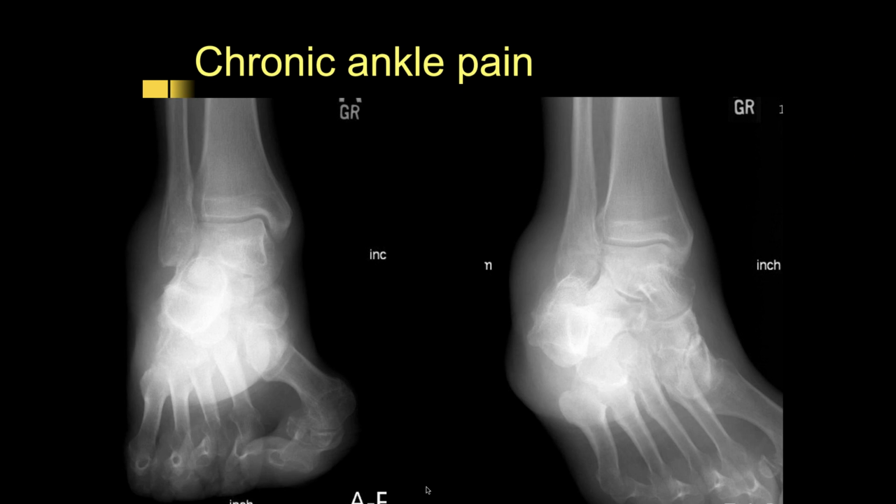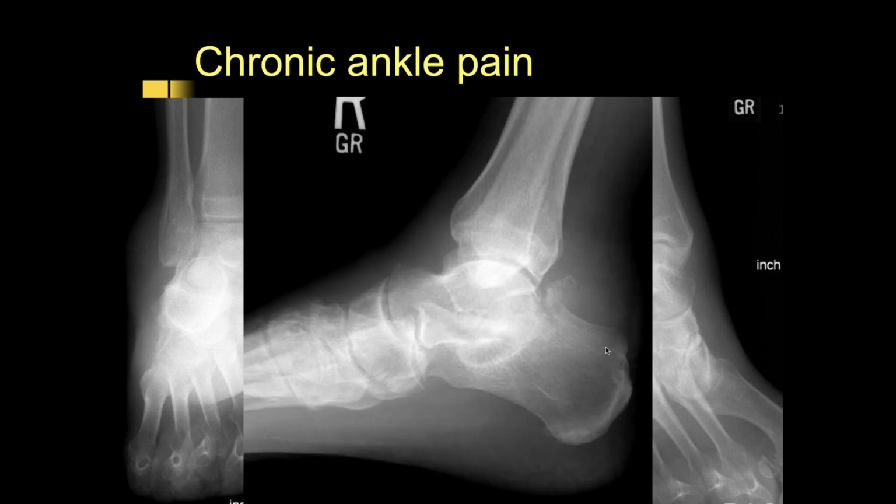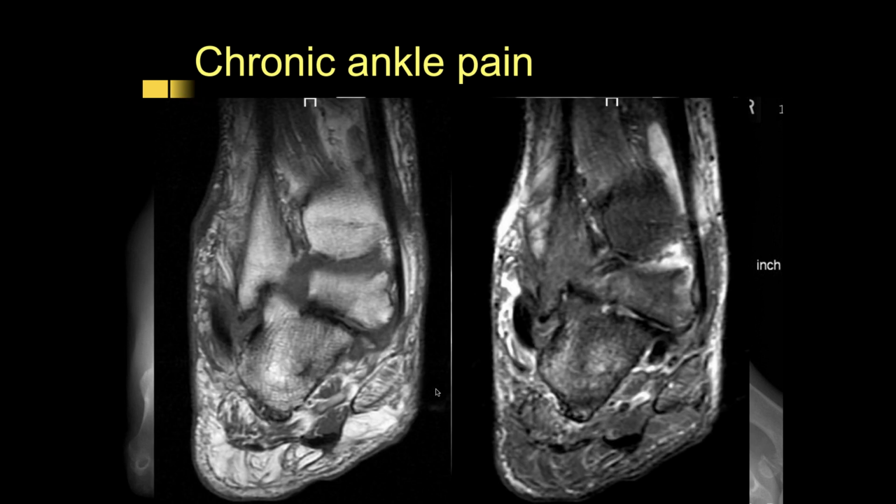Okay, remember we're talking about inflammatory disease of the foot and ankle. So what do you see here? Okay, so we see a lot of soft tissue swelling overlying the lateral malleolus. In that region, I think for the fibula, I don't see anything definitely affecting the bone. So we can still see there's a lot of soft tissue density surrounding the ankle joint. I'm wondering if there's an effusion or synovial thickening.